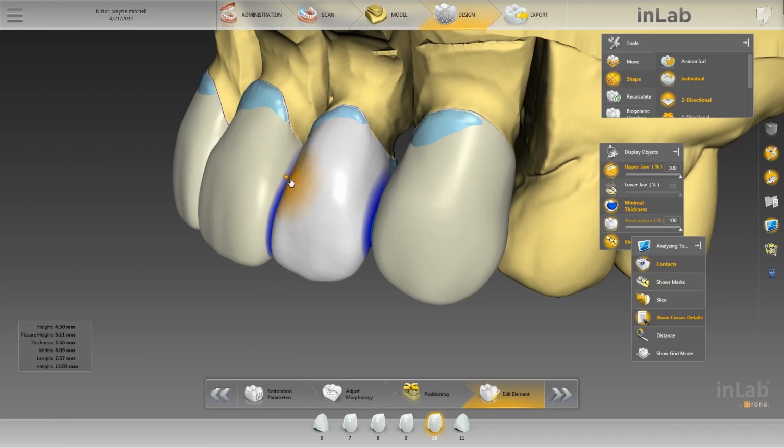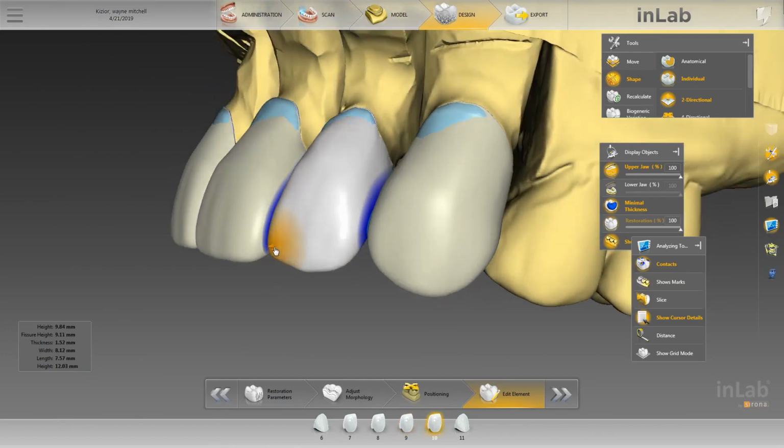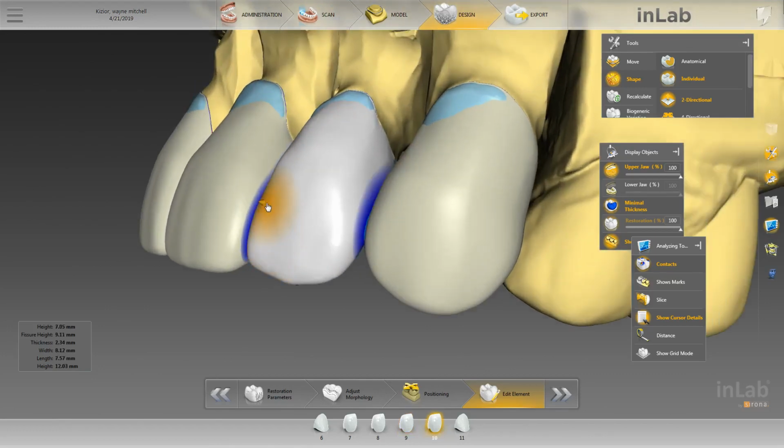And we want these contour lines to build into itself. Gradually build into itself. See, when you look at things from this angle, you've kind of got this harsh bump right here. You can either build into it by bringing out the rest, or you can eliminate it to blend it all in. Do a little bit of both. That's just my technique, that's just what I do.